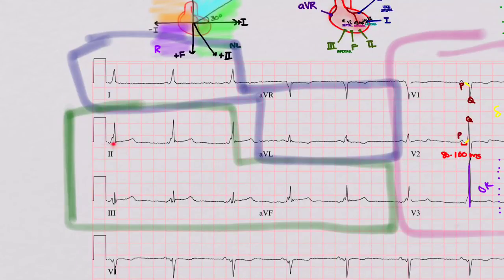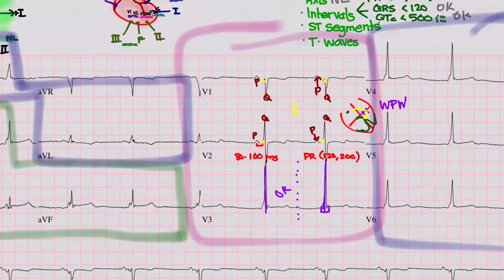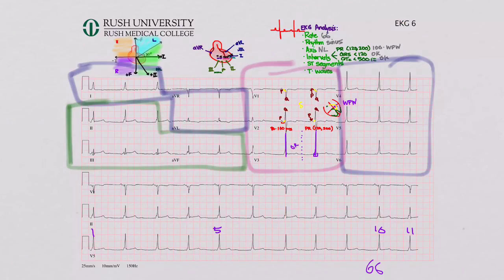It's a little bit raised here, the ST segment, but it's got a nice concave shape to it. So, take that with a grain of salt. So it's a little bit elevated with a concave shape. If you're worried about cardiac stuff, maybe that means something. If you're not, maybe it doesn't. Remember, we always interpret tests in light of the clinical picture. And finally, let's look here. ST segments look pretty good. T waves inverted there, biphasic there. So zooming back out again, what do we have here? We have a patient with WPW with a normal rate here, and otherwise some nonspecific T wave changes all over.